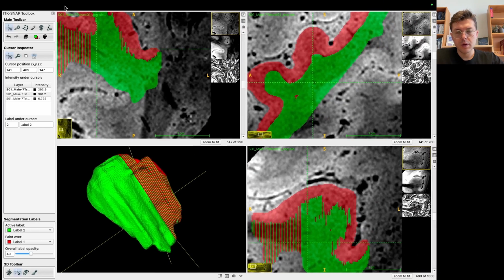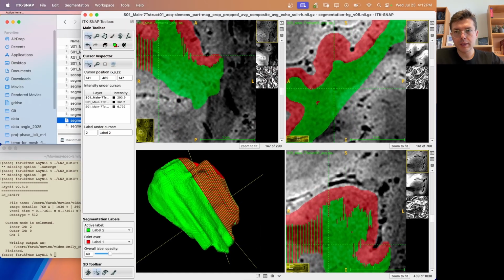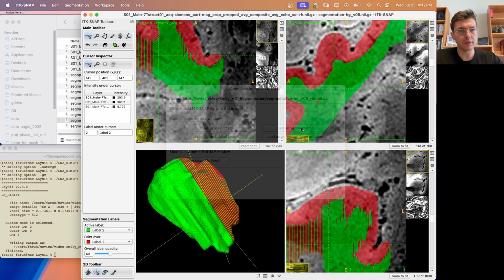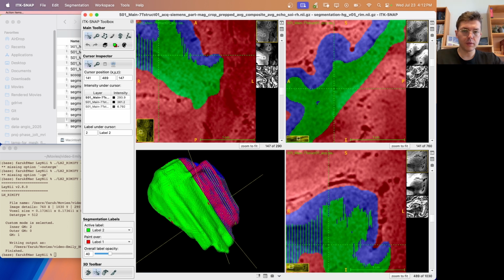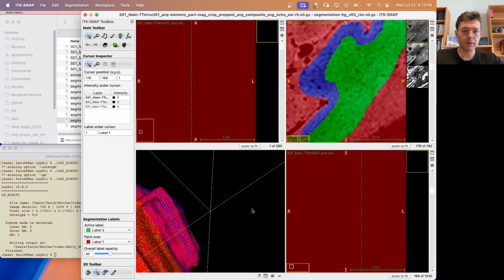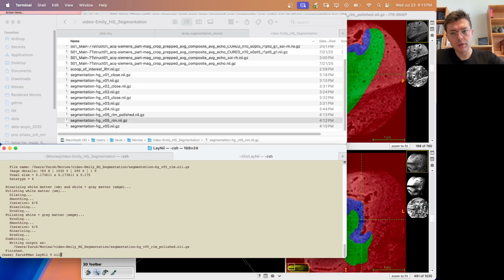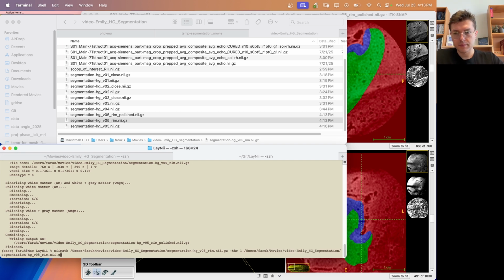I'm not sure exactly if this will work or not, but if it works, it will make our lives easy. Okay, so now it reassigns some colors. It's okay. Now, after the remify step, we need to get rid of the label 1, this red stuff.